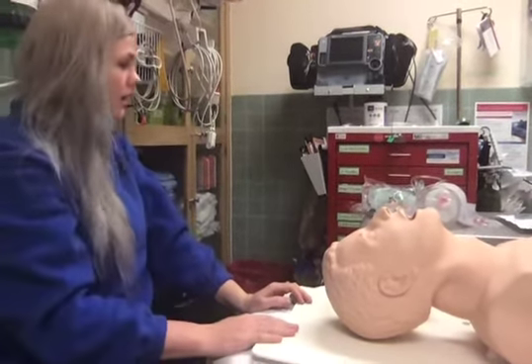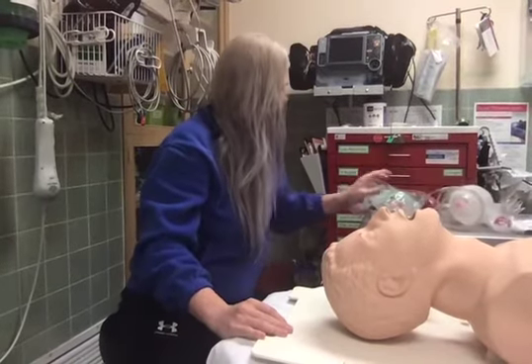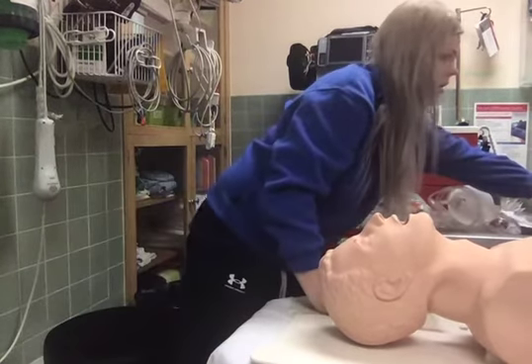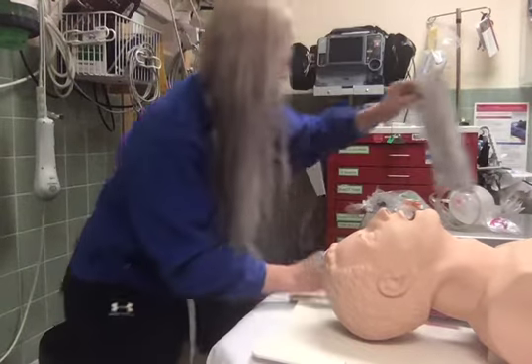So, all right, as we move forward, I mentioned ET tubes many times already. Our ET tubes are the same as everyone else's.